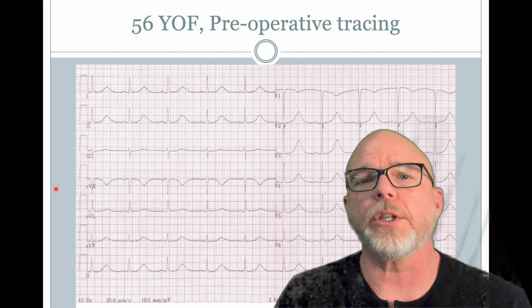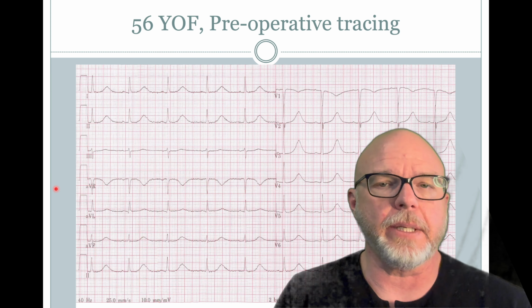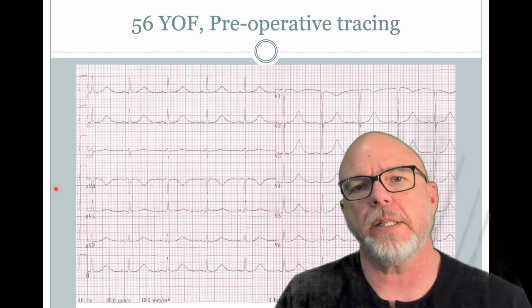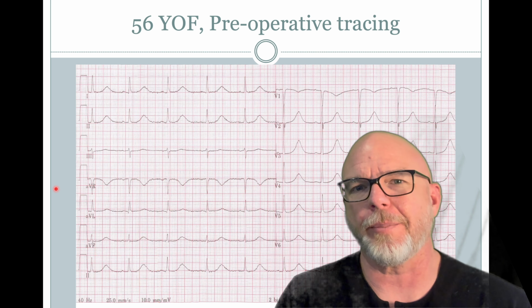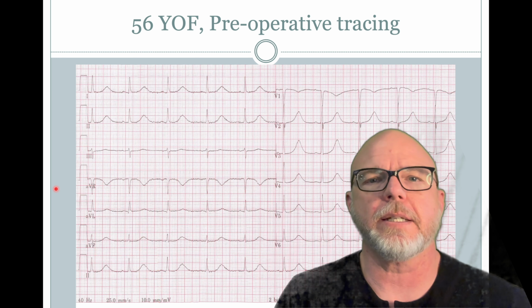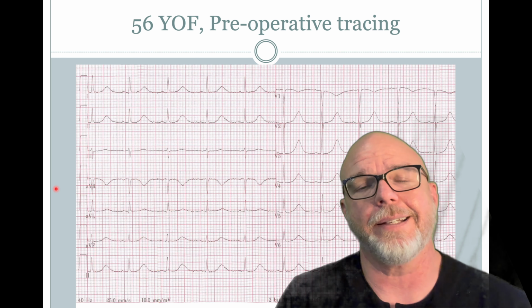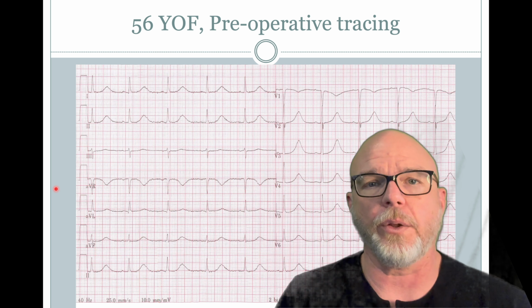The danger of a long QT is that early beats, like ectopic beats, can fall in the exact wrong spot of the T wave. It's called R on T phenomenon. And I love that word, phenomenon. It's one of my favorite words. In any case, that R on T phenomenon can precipitate tachyarrhythmias, pulselessness, syncope, sudden cardiac death, all those things.